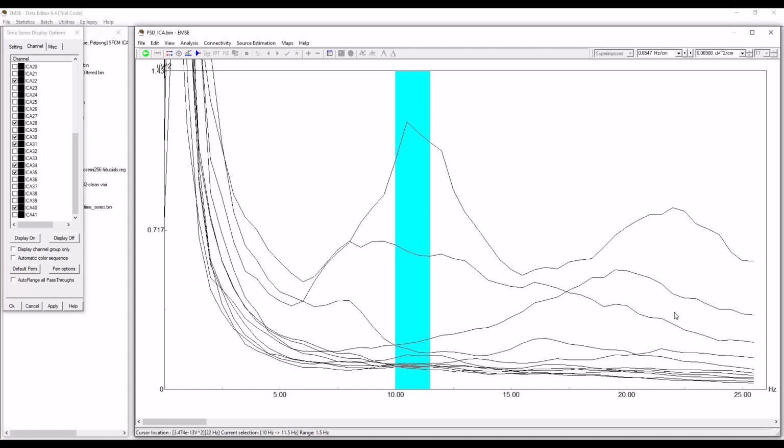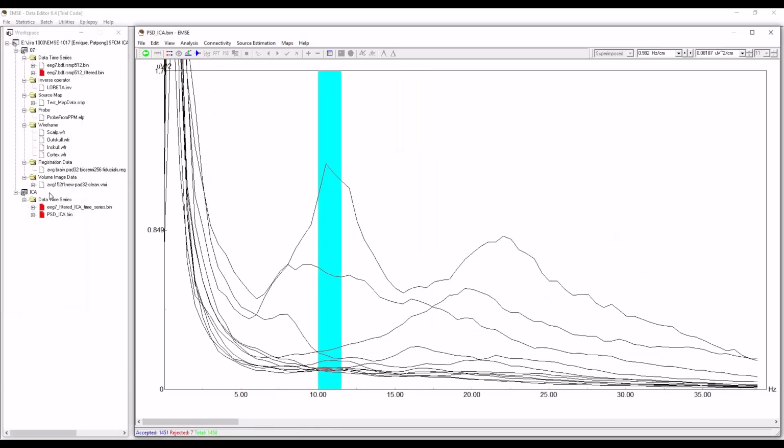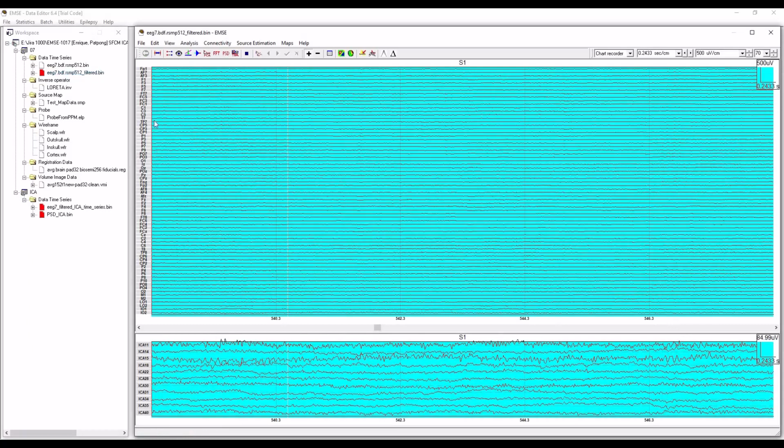You could definitely get more refined here. You could do power spectra for the different kinds, like the scales or the resting or, what's the other one, the composing ones, and then you could overlay these and see which components are discriminating between them. I didn't do that. This gets to be a bit labor intensive, but you can definitely do that. But based on these components here, then what I did was I went back to this one up here. Now I'm going back up to the scalp, and that's where I selected these. Okay, that's where these came from.